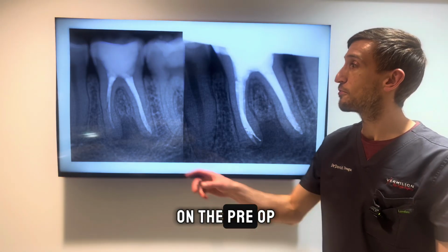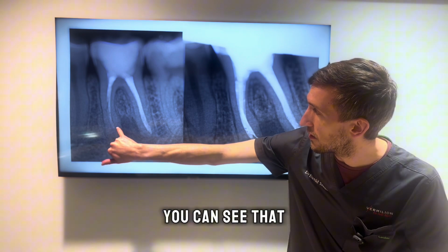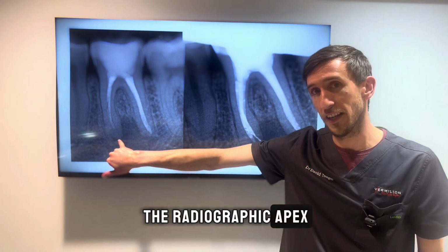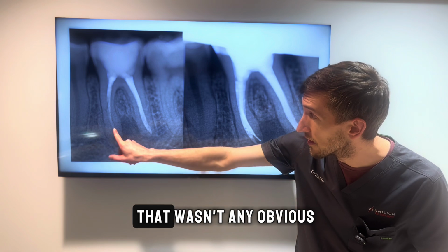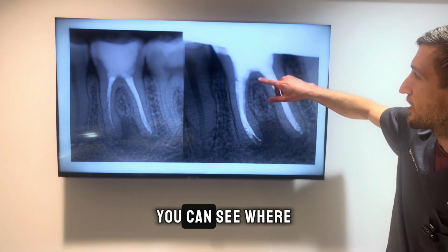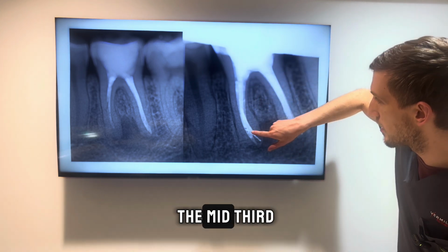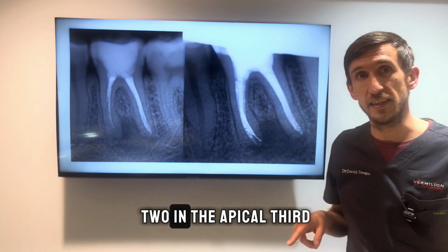You can see on the pre-op x-ray the poorly condensed root canal filling that I was talking about in the mesial canals. It was short of the radiographic apex on the mesial, and there wasn't any obvious patent canal in the mesial. However, on our post-op x-ray, you can see where there are these 2 canals joining to one in the mid-third, and then it splits into 2 in the apical third.